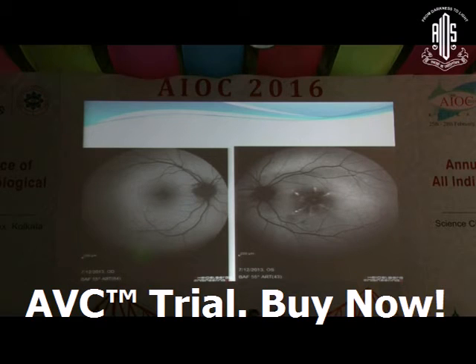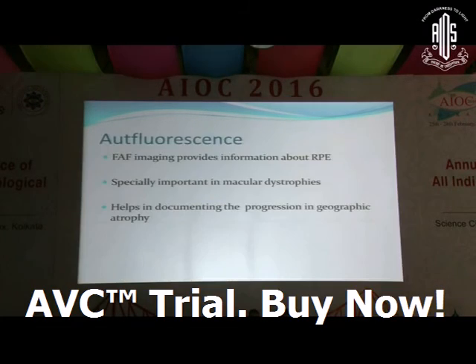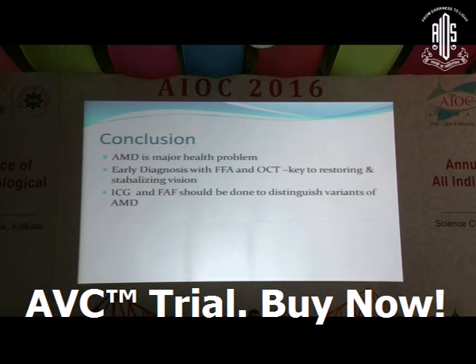So you need to distinguish these lesions from CNV and age-related macular degeneration, because these lesions do not require any treatment. Autofluorescence imaging provides information about RPE. It's especially important in macular dystrophies, and helps in documenting the progression in geographic atrophy.